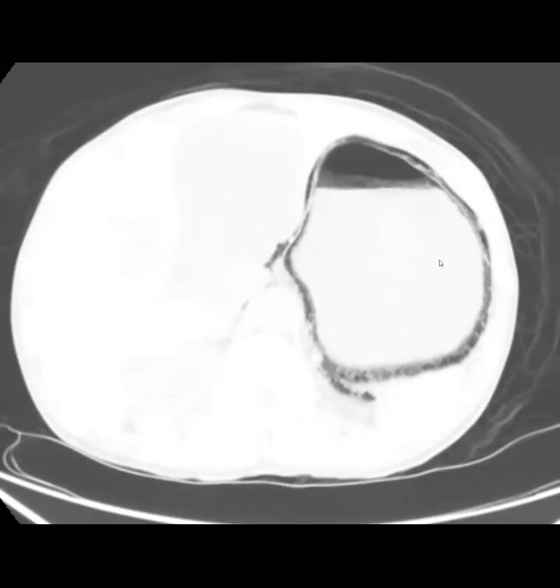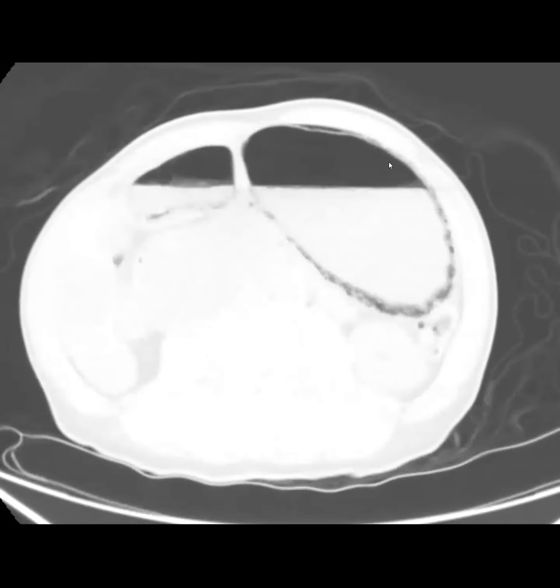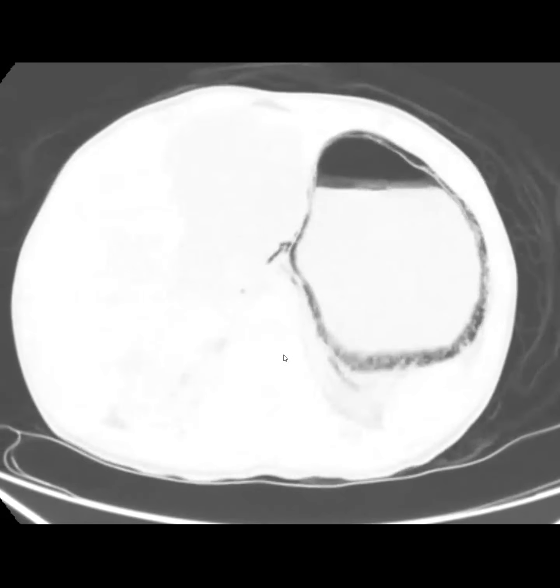And if you think about it, a lot of times we're putting NG tubes in patients and shoving them down into their stomach repeatedly. And so the most common cause of gastric emphysema is actually trauma from an NG tube. The NG tube shears the mucosa, and some of the air dissects into the wall and can dissect diffusely. This patient, we called them, like, oh my God, they have diffuse, I don't know at this point if you're going to call it pneumatosis or emphysema or what, and it's even going into their esophagus. And they said the patient's stable. And then the patient actually did fine.